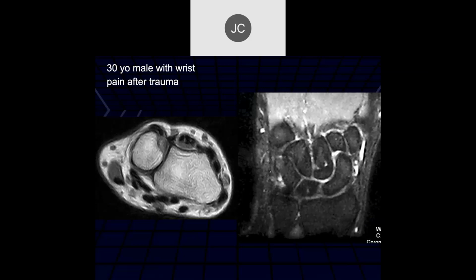Now, this is a low field scan. I used to put this in because you really need to look at the orientation first using the axial images. Here you can see this is actually a supinated image, so you have to be very concerned about evaluating the triangular fibrocartilage when you're dealing with a supinated image.